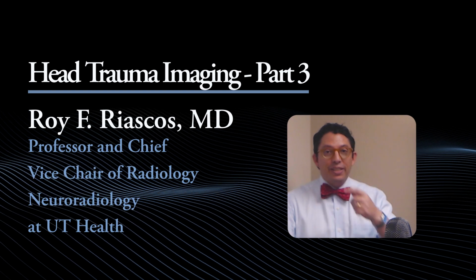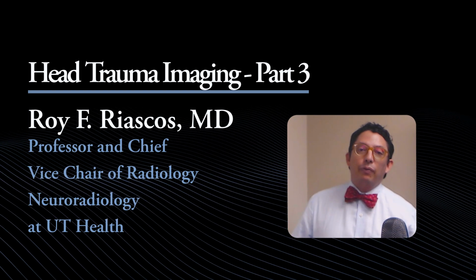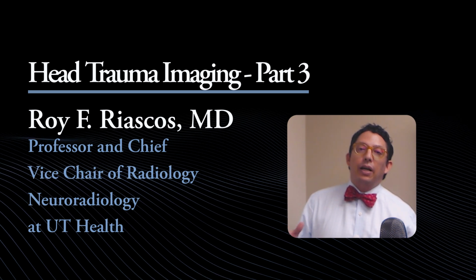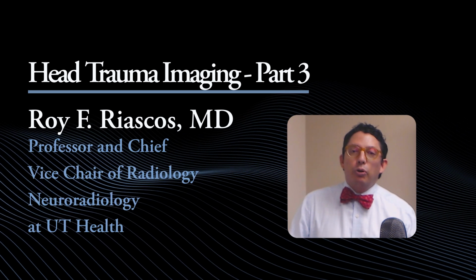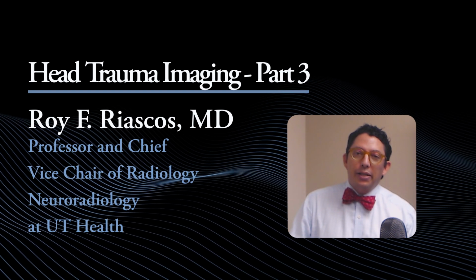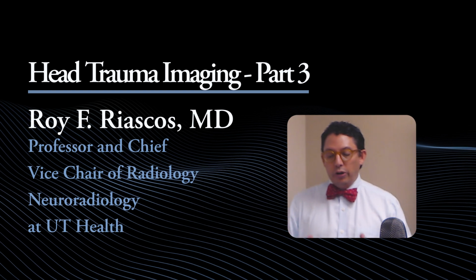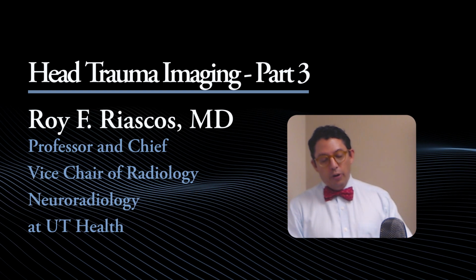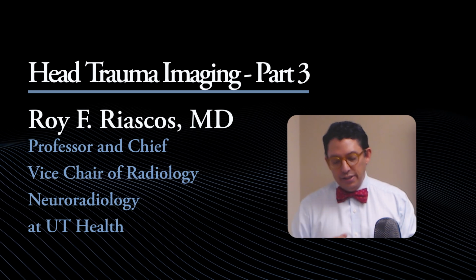Welcome to part 3 of the CT trauma lecture series. We have already seen in the previous part an introduction of CT of trauma. We saw subdural, epidural, and subarachnoid hemorrhages, which are the 3 extraaxial hemorrhages. Welcome to the next part, which is part 3, where we're going to see different entities.